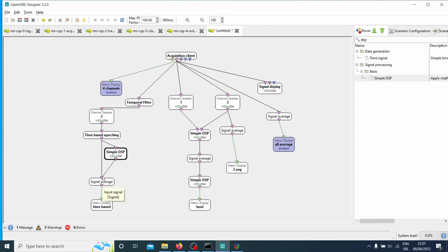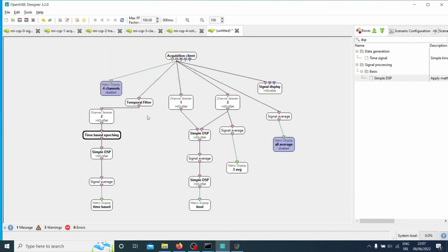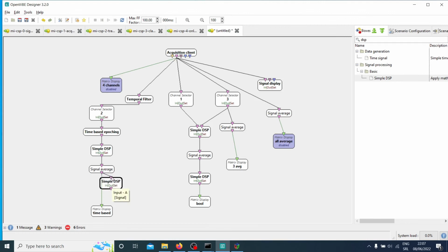What we do then is we calculate the average of all of these, and we update it quite often. Now I'm not sure, I think it's quite often in seconds, maybe something like that. I don't really remember. So we do that quite often, with a sliding window, a sliding epoch. Then you have this power, and when you average that afterwards, you want to normalize it. To normalize it, you're using the log function, the positive values, right? You don't want to use the negative values of the log function. So this is quite useful, and important for you to know.